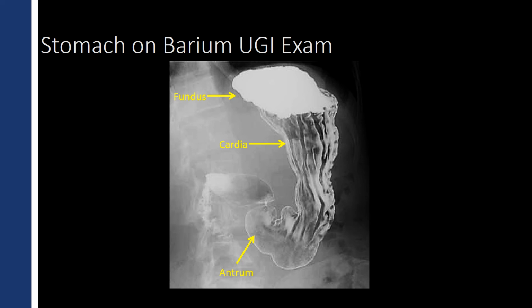And if you think of antrum as an entryway, or a foyer before an entry, so an antrum of a building is where you first enter that building. And the passageway that you're getting ready to go through is the pylorus. And the pylorus is that channel between the stomach and the duodenum. This is what, in hypertrophic pyloric stenosis, is obstructed.